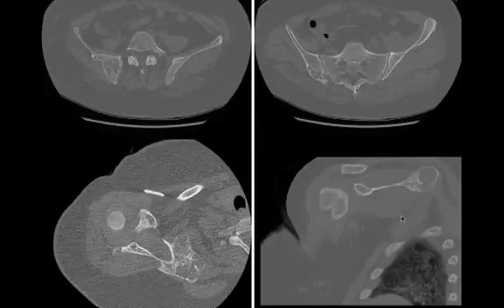This patient didn't have any underlying malignancy. They were a young patient, so they look fairly benign. So you can think about benign things that cause polyostotic conditions. And these turned out to be multiple enchondromas in a patient with Ollier's disease.